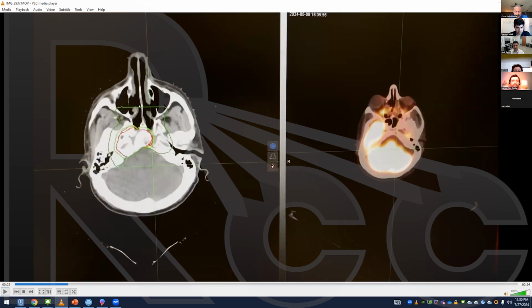You want to make sure your elective contours for nasopharynx are very important. So you're covering the posterior third here on the slice of the maxillary sinuses. You're covering the posterior third of the nasal canal. You're covering your foramen lacerum, your foramen ovale. You're covering your pterygoids. You're covering your pterygopalatine fossa.